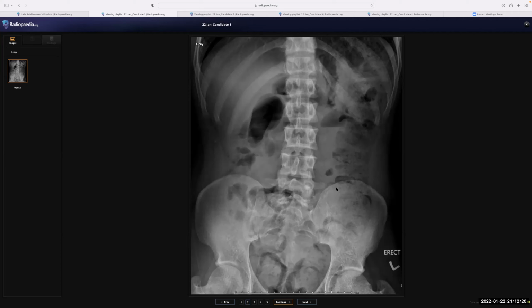So to take this further, presenting with abdominal pain, we can proceed with CT abdomen pelvis. You will go straight for CT? I'm just trying to make out, because I think there is some fluid level which is present in the bowel, which I'm suspecting is fluid filled bowel, which is probably dilated small bowel. And these lucencies, I can't really make out what actually these are. So that's why. Okay, fine.